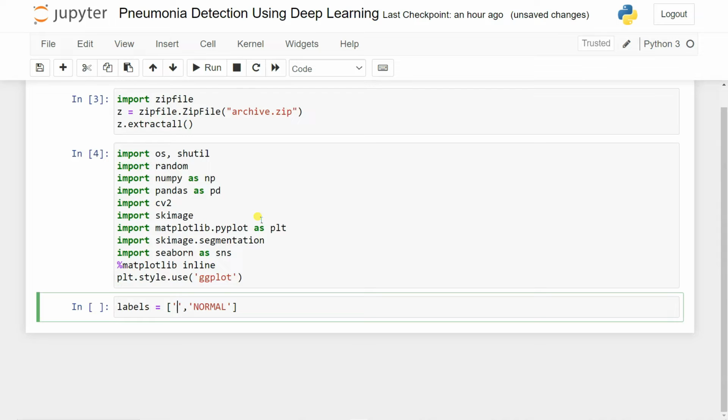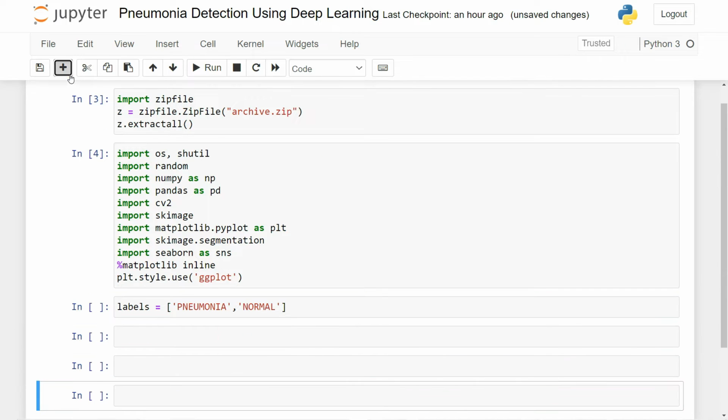Okay, normal, and we have pneumonia. Okay, we have the normal and the pneumonia. Those are nothing but two classes. So let's take a new cell.